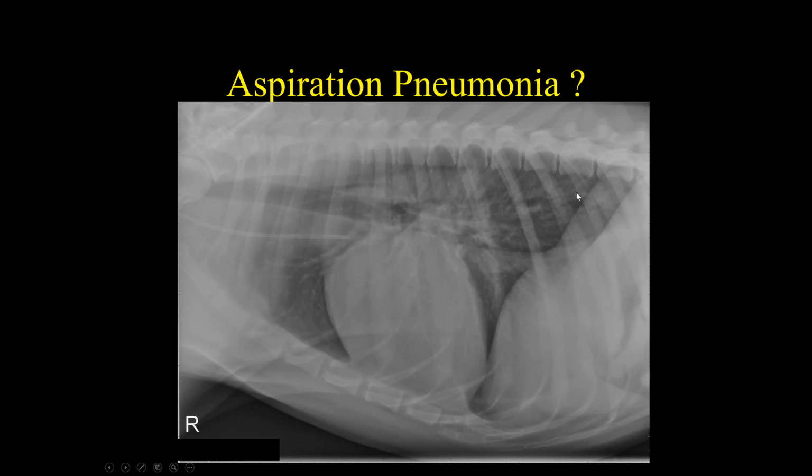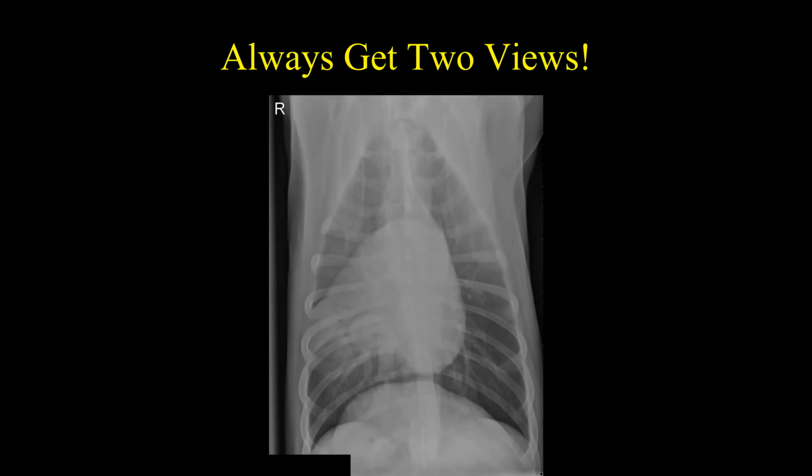So the first thing you want to do, if you see alveolar infiltrates in the caudal dorsal lung fields, is look at the heart. If the left atrium's big, that's usually due to cardiogenic edema. If the left atrium's not big and you see alveolar infiltrates back in here, that can be due to some other stuff. Basically, it's due to non-cardiogenic edema. And there's a weird one coming up that we're going to talk about that can cause that.